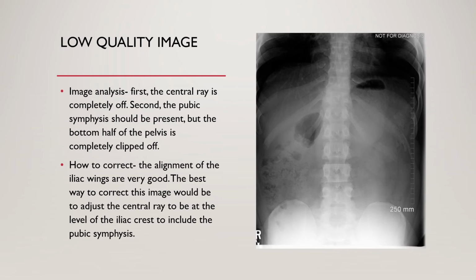So a way to correct this image would be to adjust the central ray. Everything as far as MSP and MCP looks really good. Their central ray was just off, so necessary anatomy was clipped.